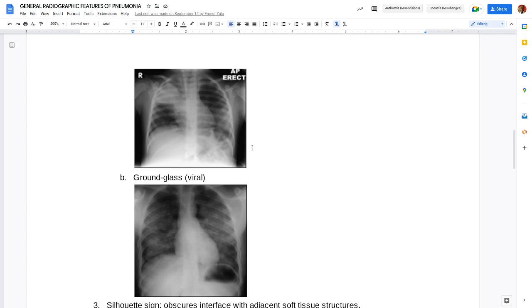And that's what I'm trying to demonstrate in that image that is on top on your window right now. You see the whiteness of that patch in the right upper lobe. You've seen there's an arrow there in the top left. That's the right side, yeah? And you've identified where the white patch is.